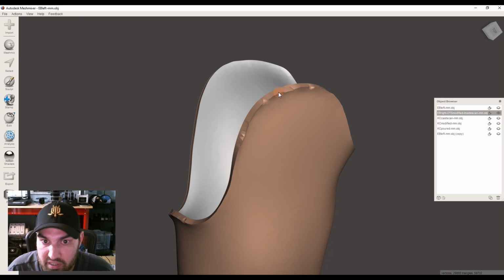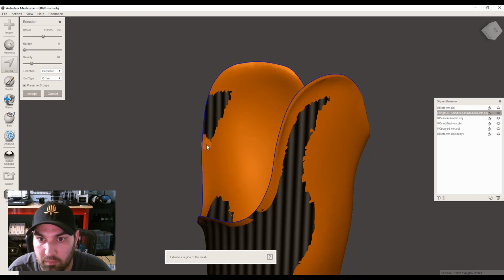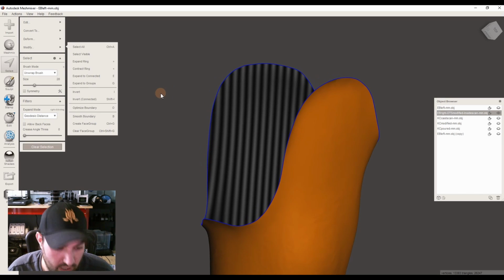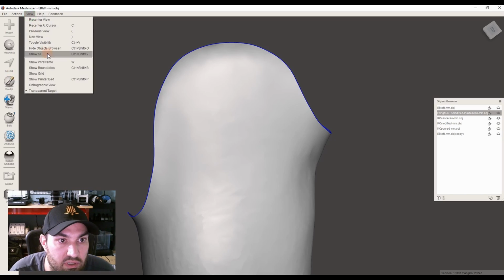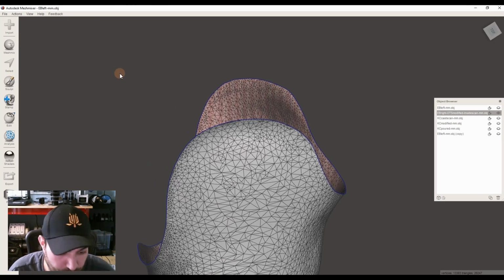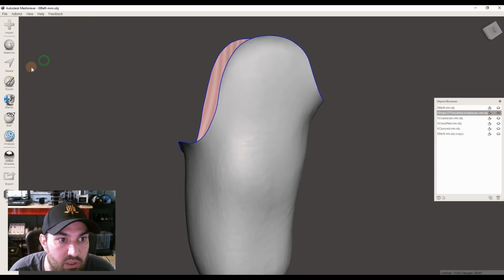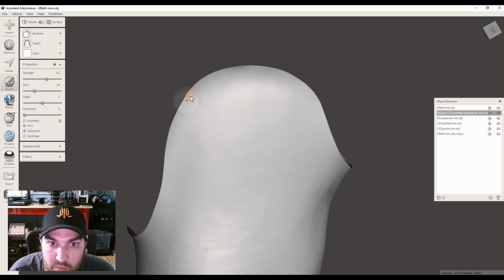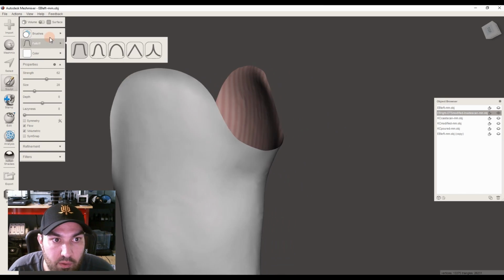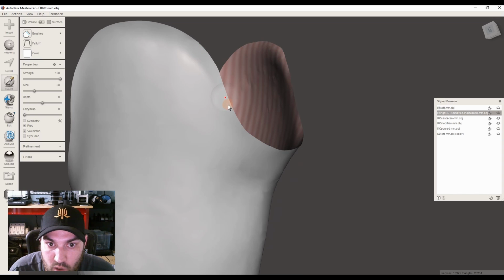Now you can see these edges here, still kind of rough. Let's back up. And usually what we would do to clean up those edges is that sculpt tool. But in this case, it wasn't doing the whole job. So you can come in and turn the strength up and try it again and see if that helps. In this case, it looks like it will. The other thing, sometimes you have to go to this flatten tool. And sometimes that helps to do that.